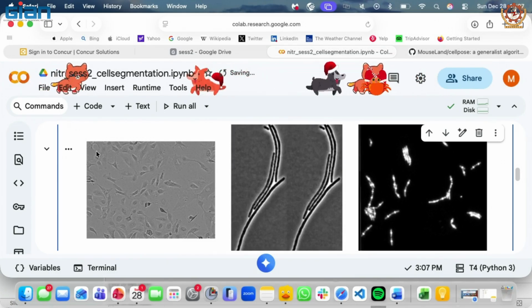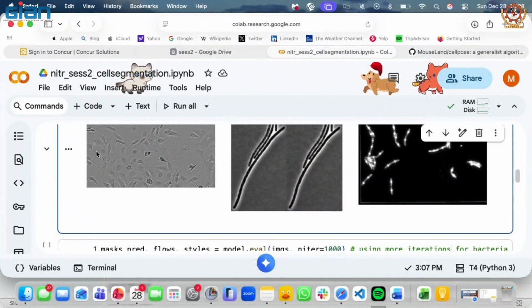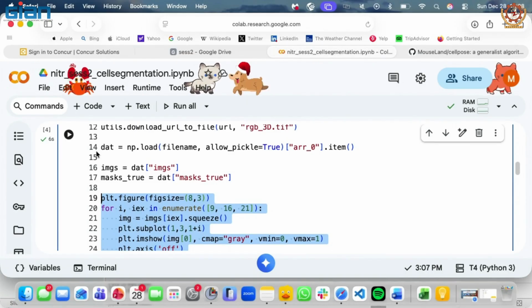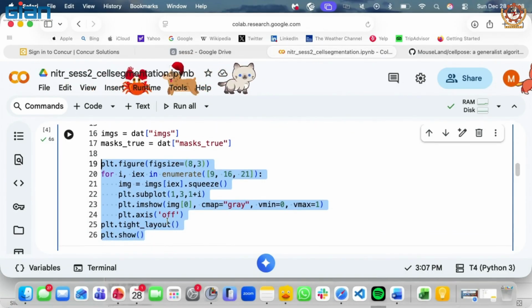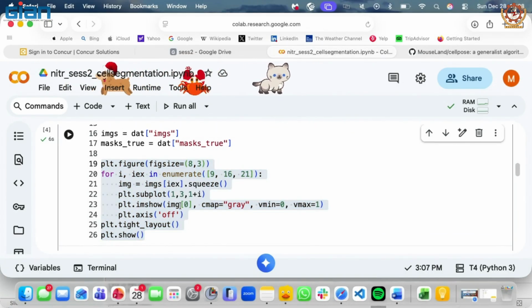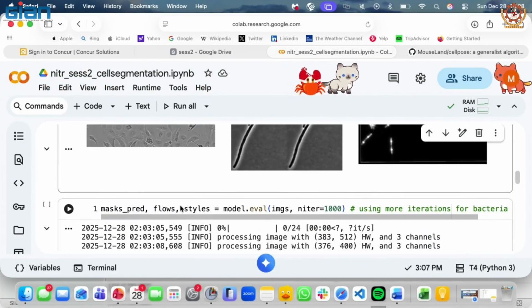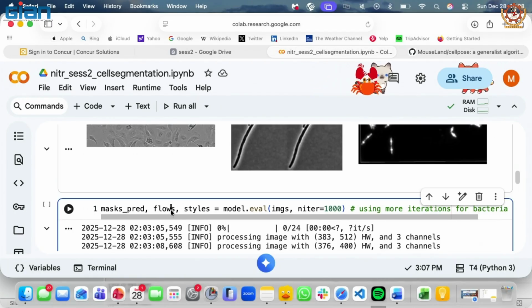So, anyone? From a machine learning perspective, we have an image, we have the mask, and we just want to segment it. It doesn't matter what the cells are, but if you're trying to do some downstream application, you need to know what the cells are. Even I need to know if I'm planning to work with cells in the future. Okay, so these are the images. Let's try to plot some masks. We'll come to the masks later, because the mask is basically the ground truth.